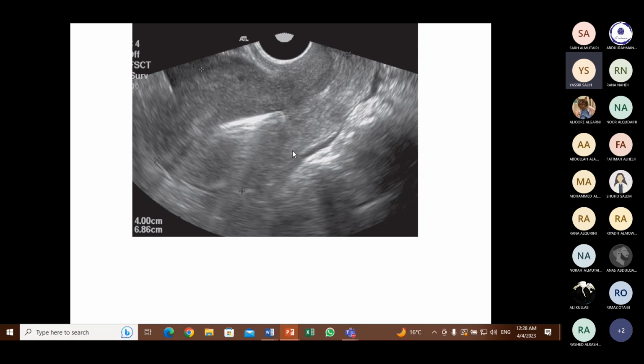Just to make sure that you know some things, please comment on this. What is the imaging, for example? It is, say, a CT of what, which part, and what do you see? Ultrasound, ultrasound of what?